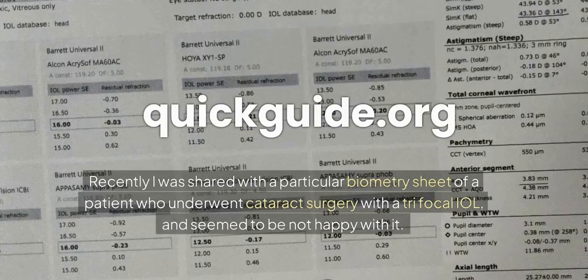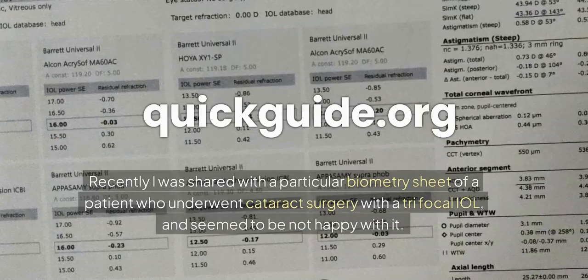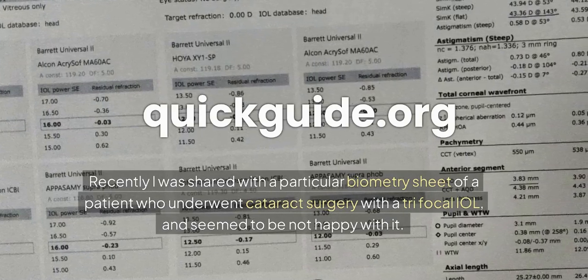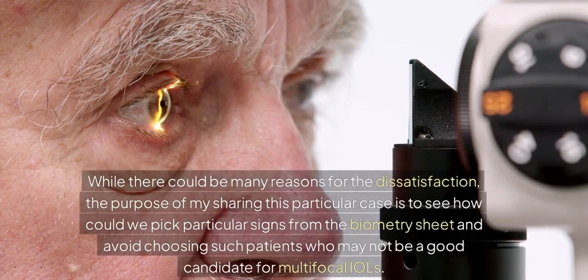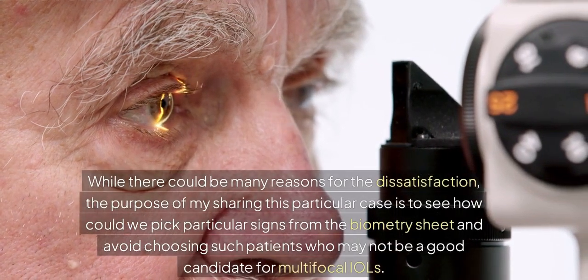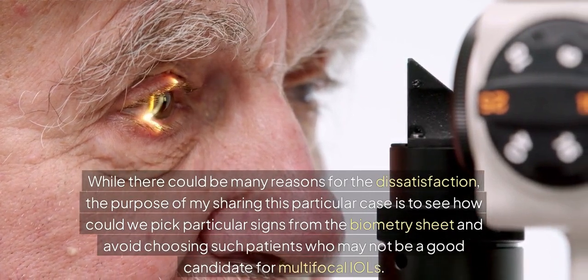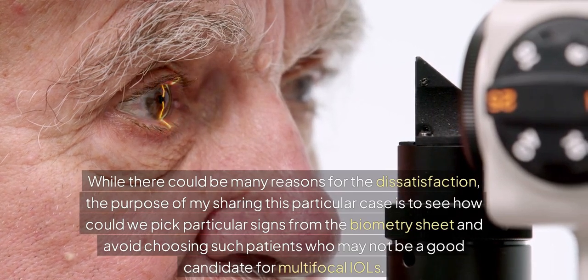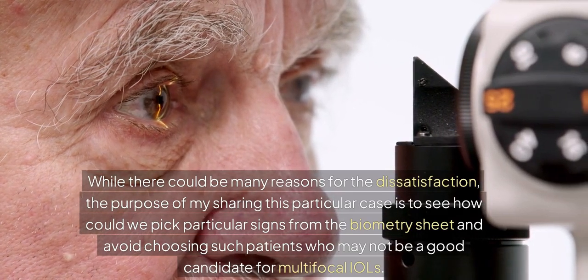Recently I was shared with a particular biometry sheet of a patient who underwent cataract surgery with a trifocal IOL, and seemed to be not happy with it. While there could be many reasons for the dissatisfaction, the purpose of my sharing this particular case is to see how we could pick particular signs from the biometry sheet and avoid choosing such patients who may not be a good candidate for multifocal IOLs.